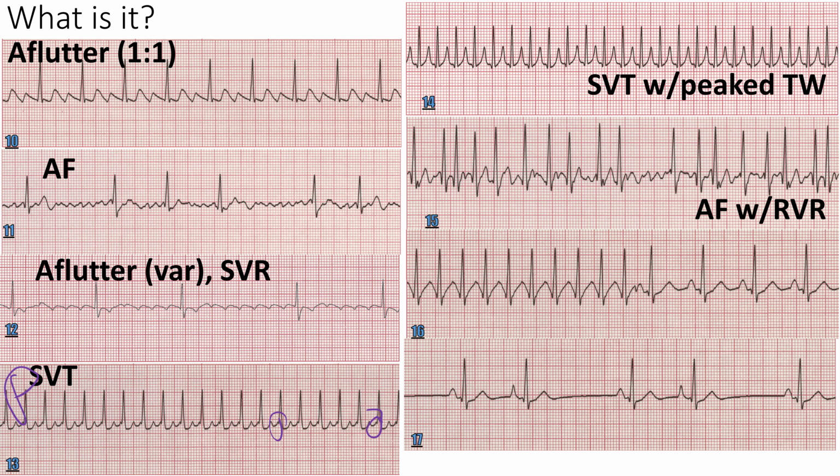And then the next one, number 16. Which part of the rhythm do we assess? The first half or the back half? The back half is normal. The first half is not. It's a little run of an abnormal rhythm. A little run of what? PSVT. There's no P waves there. That's just a whole huge T wave, right? So we got a run of PSVT, and the rate is pretty fast. It's hitting up to almost 250, right? They're going to feel their heart race.